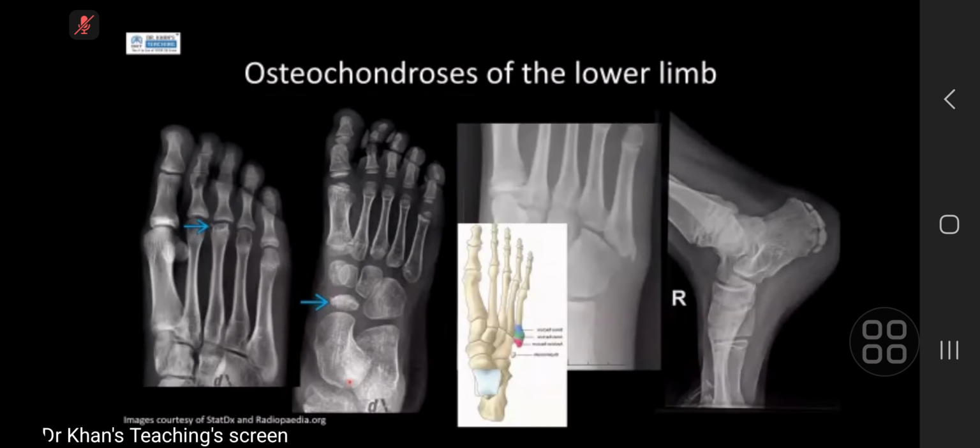Okay. Other areas of osteochondritis, which you might know, include the metatarsal heads, the navicular, and at the base of the fifth metatarsal, which has a name I can't remember. Just remember it can be a chronic traction injury, similar, or a fracture or apophysis. So this one's a hard one. Things to look out for are whether you've got soft tissue swelling and whether the patient's asymptomatic, because this could also be a normal apophysis site.